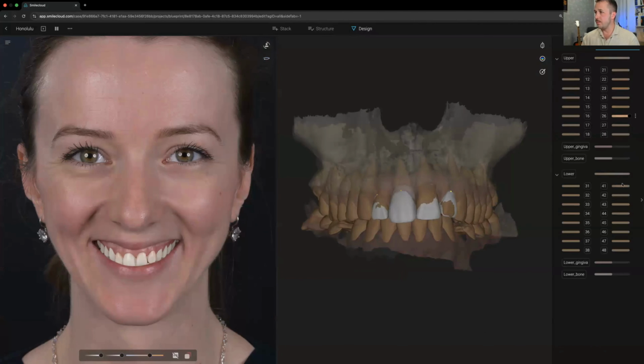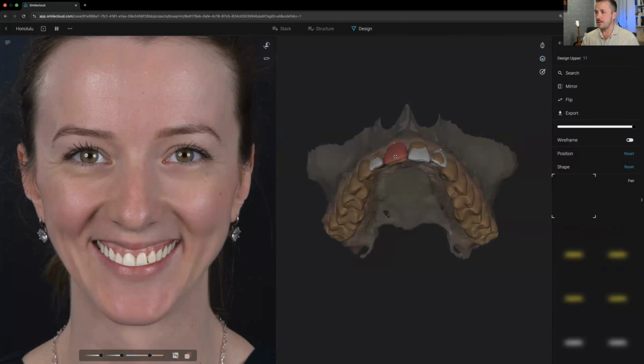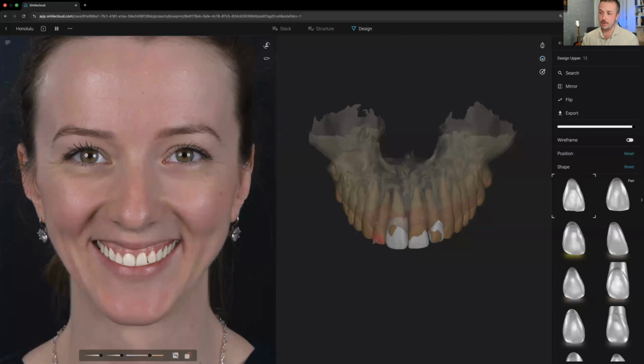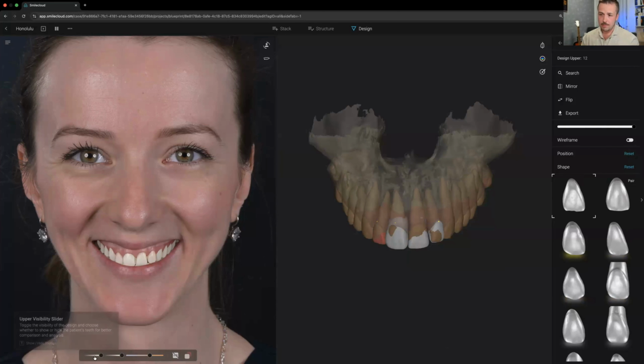So you can also move something which is in your way. I'm going to remove the lower jaw, put this in the reference point, and then just start designing a little bit. Okay. So you can immediately see when I push the tooth under the gums, it becomes invisible. This part is not visible anymore on the photo. Why? Because our design is now being placed underneath the tissue. As you can see, these yellow points on this circular square, when I push the design up, it basically goes underneath the gum level. So let me just remove the lower teeth.